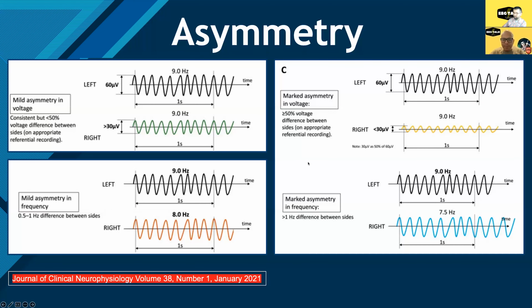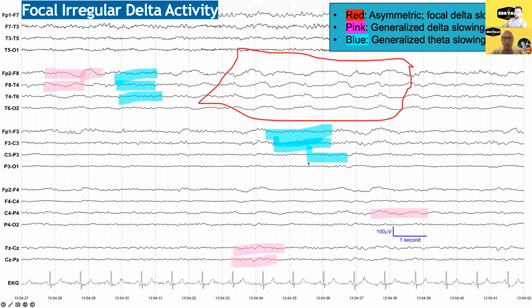Hopefully, we can have some examples now to practice this on. Oh, look how lucky we are. There's an example right here. Can you describe this one? Yeah, I think there's something going on here.